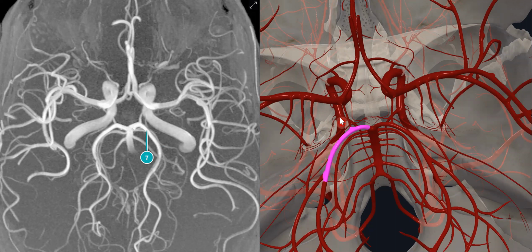But we still have the anterior and middle cerebral arteries. From where will they come? From this big artery. This is the internal carotid artery that always gives no branches in the neck and will pass through the cavernous sinus, and then will give this artery here. This is what's called the ophthalmic artery. After this it will give the anterior cerebral artery, this is the left one, and the middle cerebral artery.